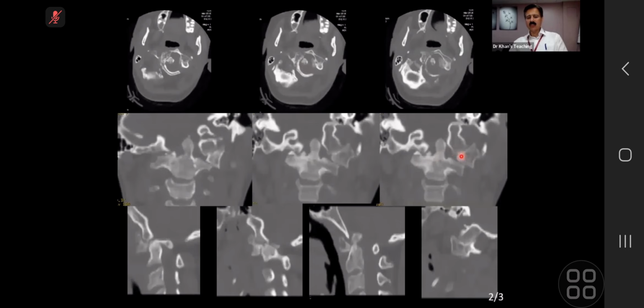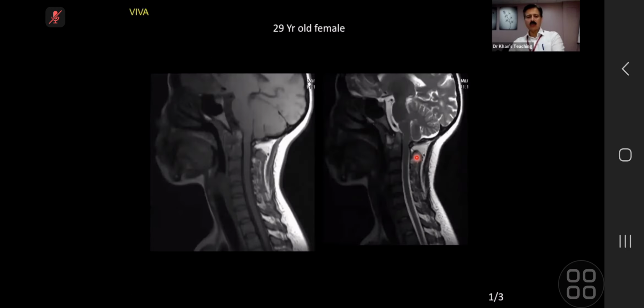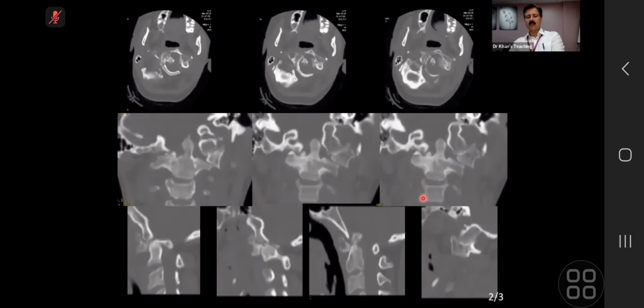Now you can understand what has happened in this case. Look at the lateral mass. This lateral mass has also subluxed. But on this side, there is no lateral mass. It is all destroyed. So a similar finding to the RA finding, even more blatant. And this patient was only 29 years old, and this is TB arthritis, which has caused this.